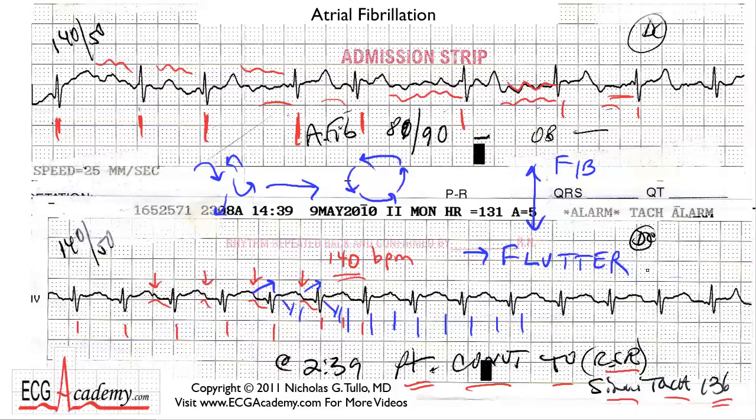Well, that's a debate I can have with myself in the advanced course, but for now I think we've talked about atrial fibrillation enough, and I hope you have a better idea of how to diagnose it. In the last chapter in this section, we'll talk about atrial fibrillation with aberrant conduction, which can give rise to some really confusing-looking wide QRS complex tachycardias, and I'll explain what Ashman's phenomenon is and how you can use that knowledge to distinguish between atrial fib with aberrancy versus some kind of ventricular tachycardia.